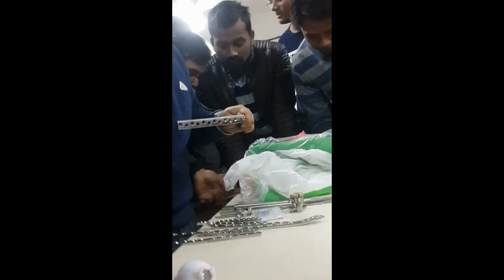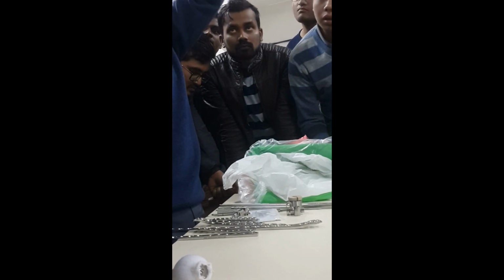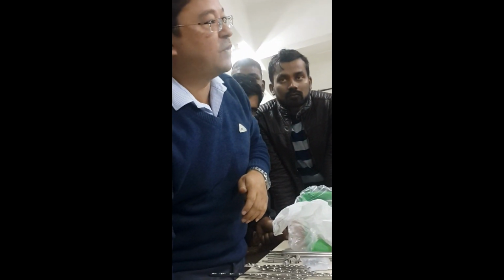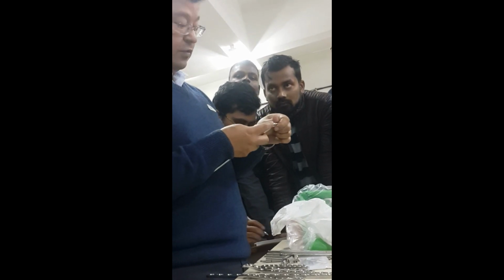Even in the distal femur you can put one, and that is known as the DCS, dynamic condylar screw. Okay. What is the difference? This angle is 135. That one is 95, almost a right angle, and that is used for distal femur supracondylar and intercondylar fractures. If they ask you about the angle, for the proximal femur it is 135, and for the DCS the angle is 95, okay?